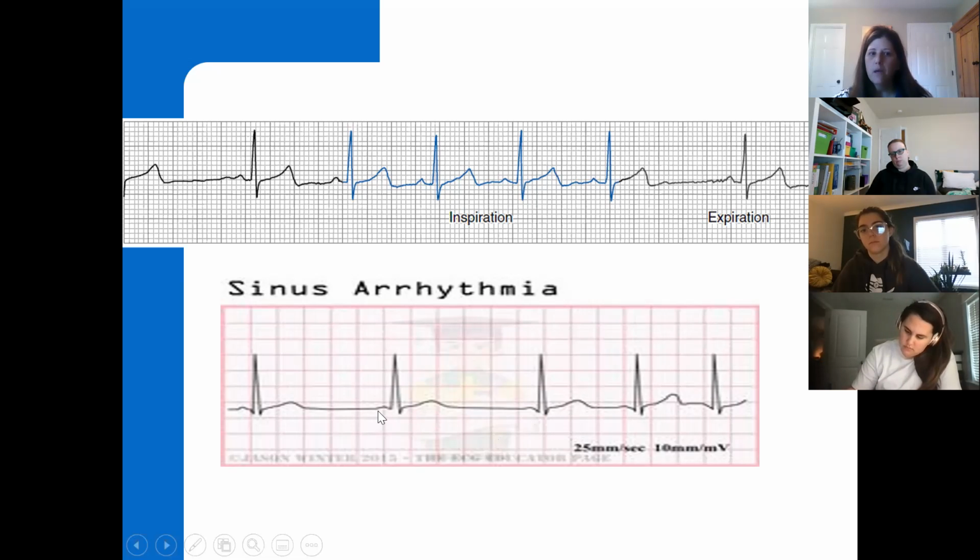But you still see a P, it's very flat compared to some of those that we've seen here in this example. This one, it's a little more peaked and noticeable, but QRST. So it's all really looking normal. It's just that this might be their normal, and then this is speeding up a little bit, or this could be their normal, and this is the slowing down period. Most likely that's the case. With inspiration, it's a little bit quicker, and then this was probably from the previous breathing cycle. So that's just something that can happen.